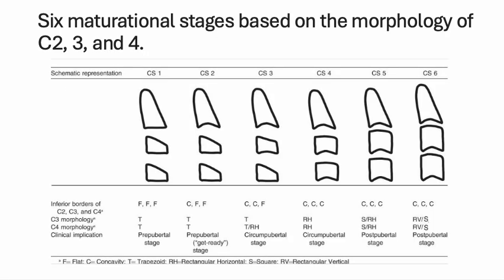This is a short training video about the cervical vertebral maturation staging system. The cervical vertebral maturation staging system has been developed by the orthodontic community and is now widely used in practice to assess timing of the adolescent growth spurt, specifically as it relates to mandibular growth, which can help orthodontists to choose the timing of various interventions that involve growth modulation.